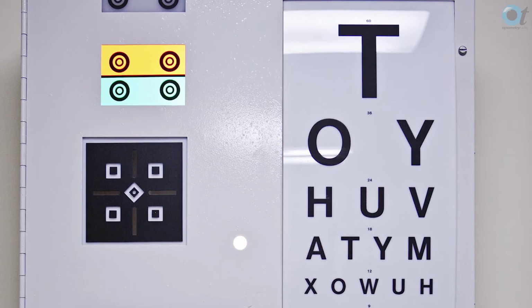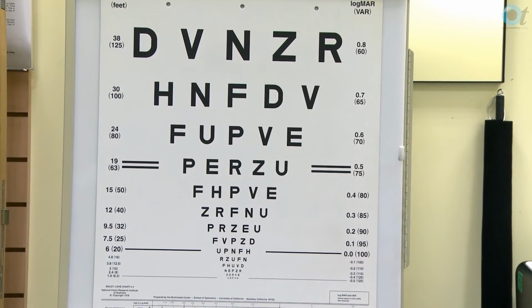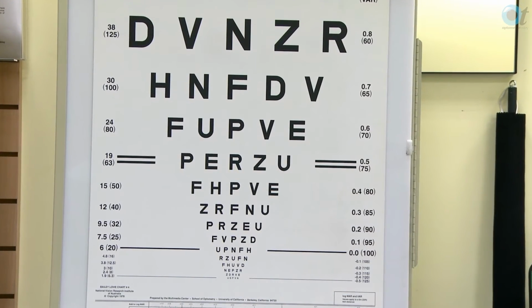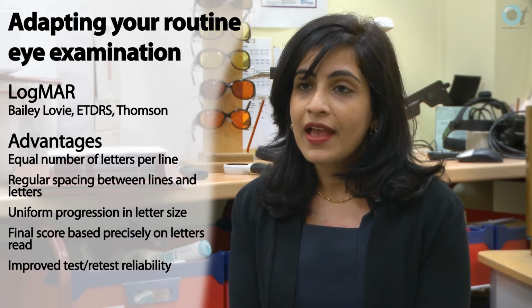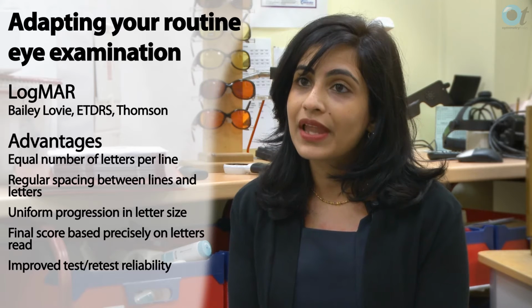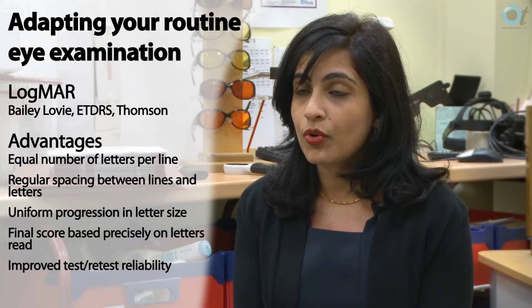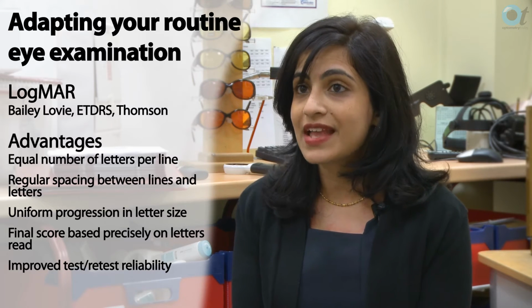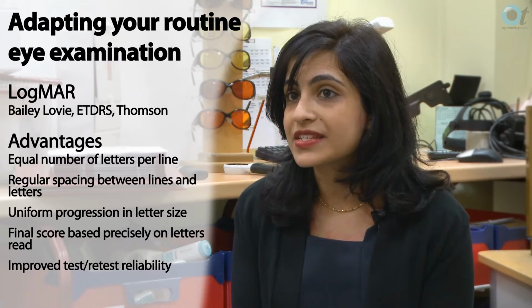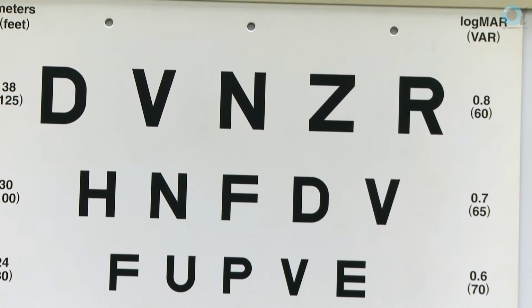Historically, we know that visual acuity has been measured using the Snellen chart. However, within low vision, we tend to use logarithmic acuity charts, for example, the Bailey-Lovie or the ETDRS. And there are a number of reasons for this, but probably the most important reason is that they have more letters at the lower levels of acuity. So for example, between 6/60 and 6/24, there are 15 letters on the ETDRS. And if we compare this to the Snellen chart that would only have perhaps 2 letters, using the ETDRS or a logMAR chart will enable us to have a more precise measurement of VA.